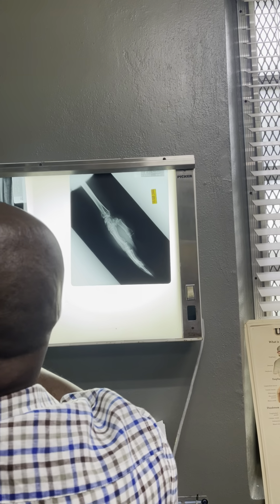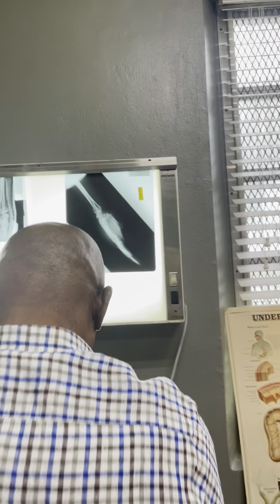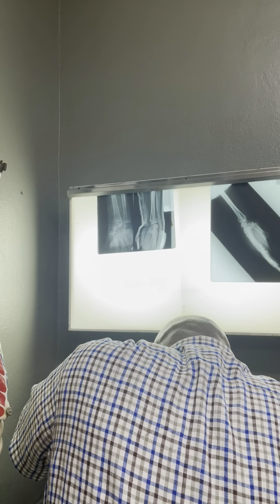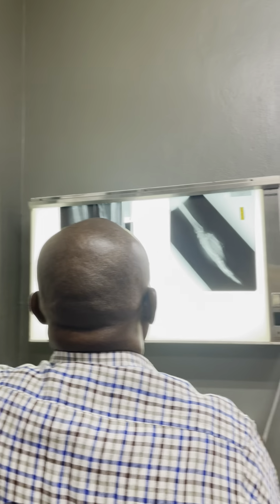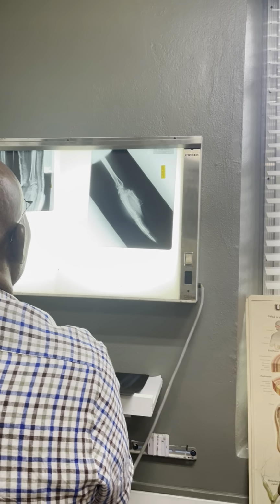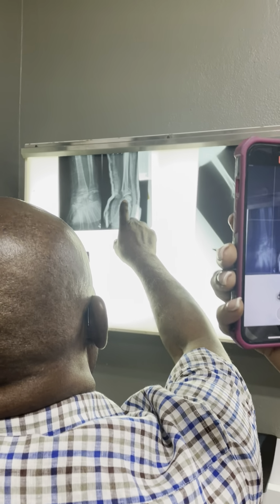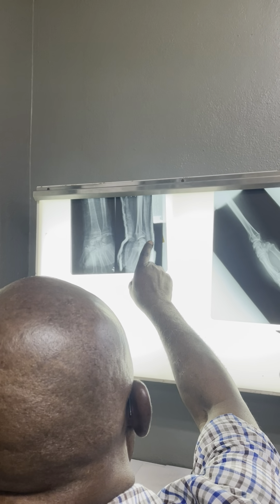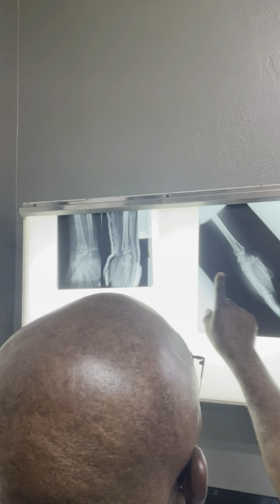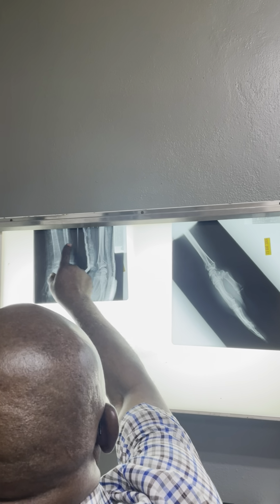Deformity, right? But I mean, I want you to tell me about the characteristics. Look at the fracture again. Don't just look at it, look and see how the bone is. Where's the hand? Has the hand gone backwards or forward? Here's the palm of the hand, here's the back of the hand. Look at the fracture here.